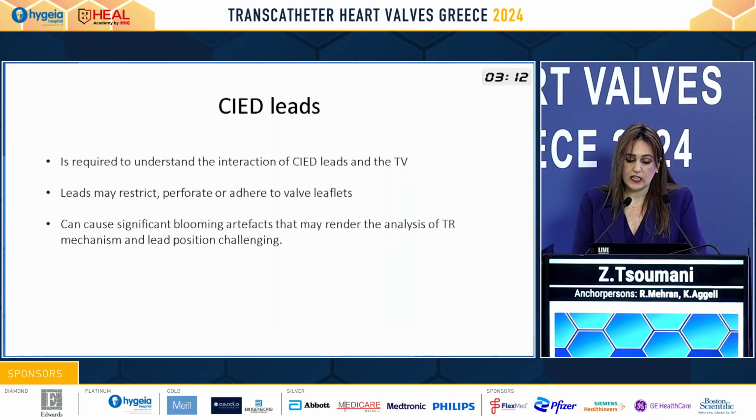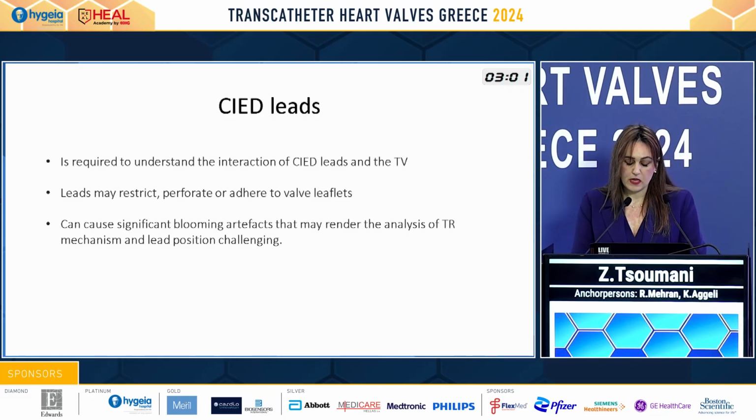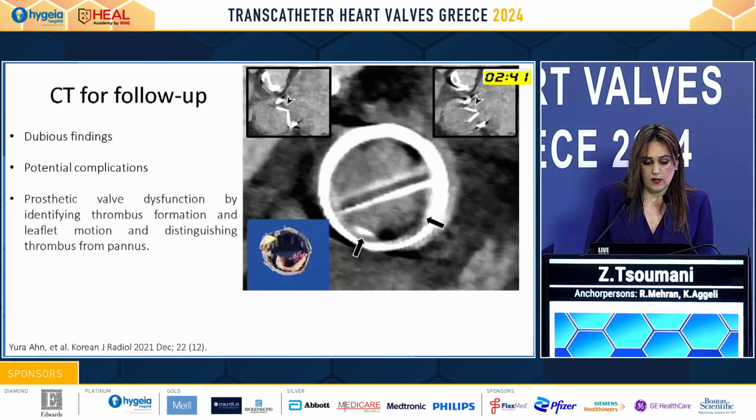Another important area where cardiac CT can help is to understand the interaction of the leads with the tricuspid valve. However, this can be limited because of the significant blooming artifacts from the leads, and echo would be better.